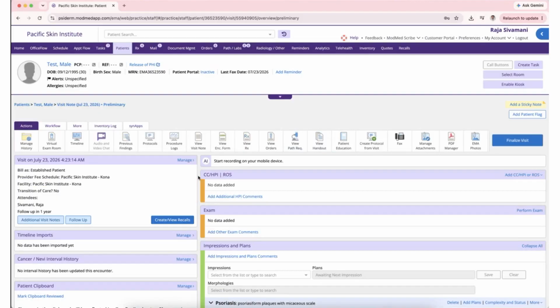And that's it. Very easy. I mean, we took a little bit of extra time to show you how to do it, but in real time, it's quite easy for you or your medical assistant or scribe to really get through this and put these orders in. And the bottom line is, you don't want these orders to be cumbersome. So Phothera has put a lot of effort into making sure this is very streamlined and easy to order, so you can do it on the go while you're seeing your patient, and you don't spend a bunch of extra time trying to put the order together.